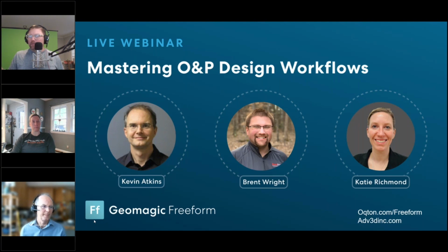That's in the weeds. Oh, sorry, Brent. There is a direct export to mesh from clay file, and you can reduce as you're going through that. And that's a pretty intelligent command because it will keep the detail as you're reducing. So you don't have to go clay to mesh, then reduce, then export. You can go straight from clay to reduce to export.